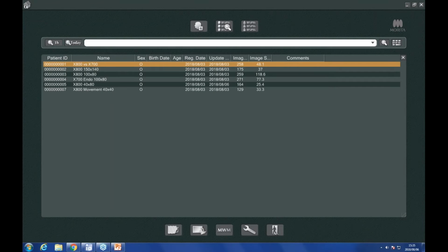Now I'm just starting up my screen sharing. So hopefully on all your sides, you're able to see what I see. And what you're seeing in the background here is the user interface for our i-Dixel software.